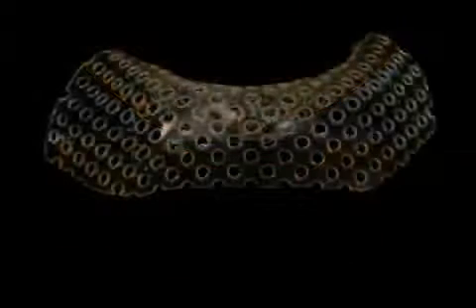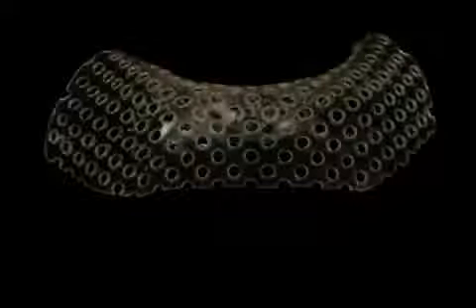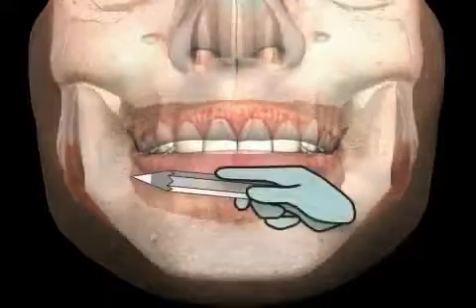Using the stereolithographic model, an absorbable foil was formed, which will serve as a kind of placeholder for bone substitute material. Here you see an image of the mouth. You can recognize the lips, parts of the tongue, the base of the mouth, and the missing jawbone.